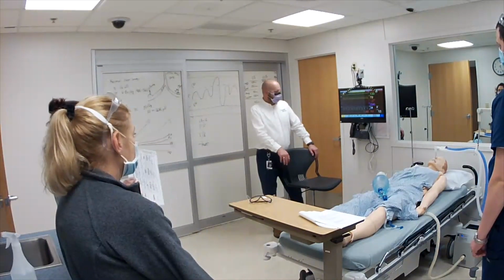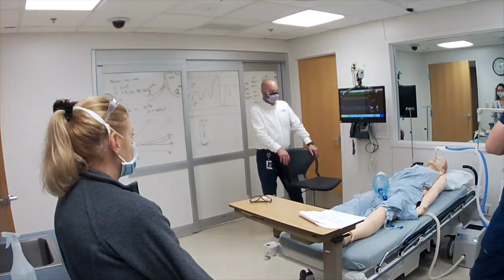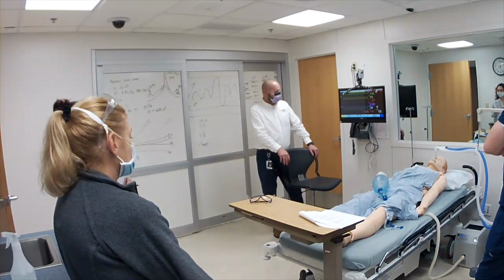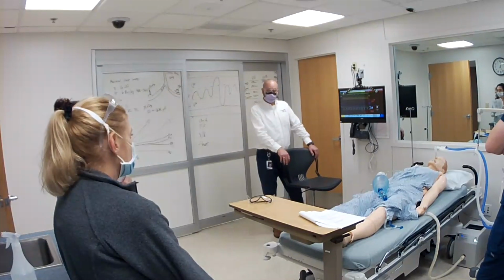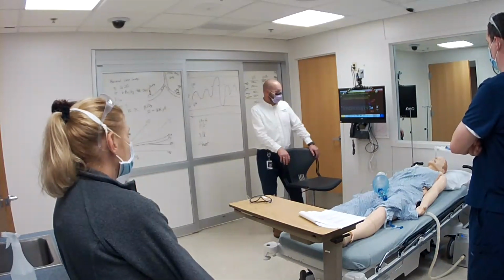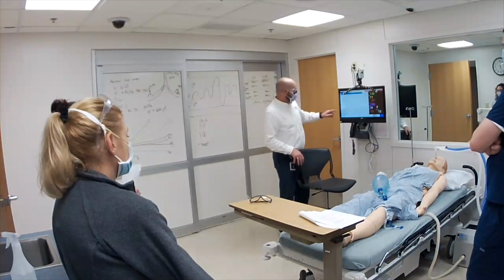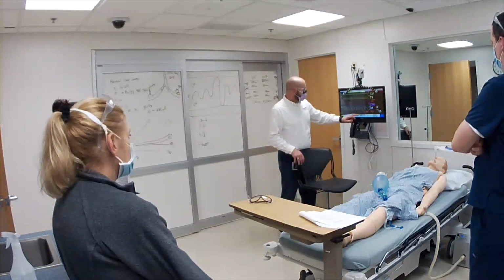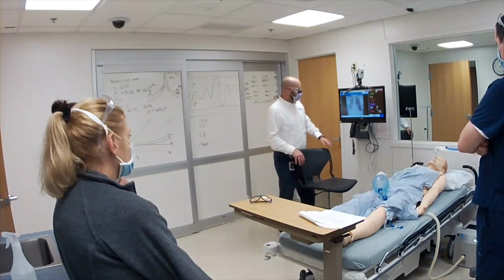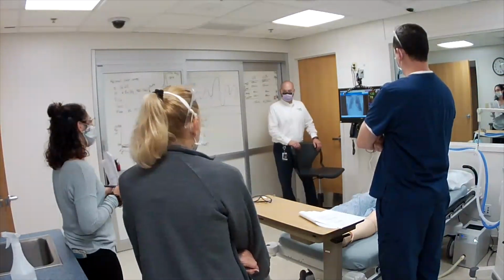How would you investigate that? A chest X-ray. We could do a chest X-ray. You shouldn't, but we could. And we will. So here's his chest X-ray. What do you see? Now this is a chest X-ray that should never be taken. This is a clinical diagnosis, and hopefully you won't ever get this X-ray back. What do you see? Hyperexpanded. Worse than that.